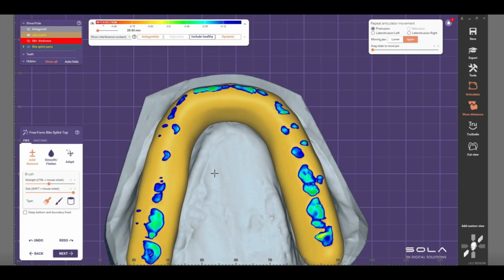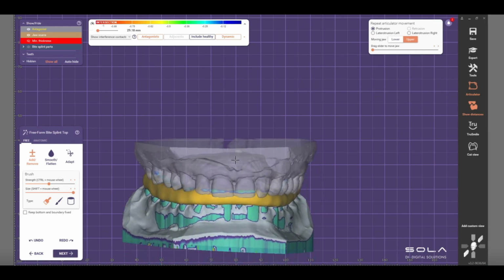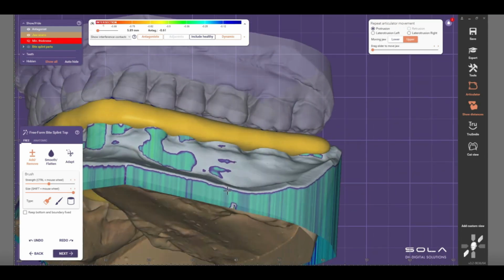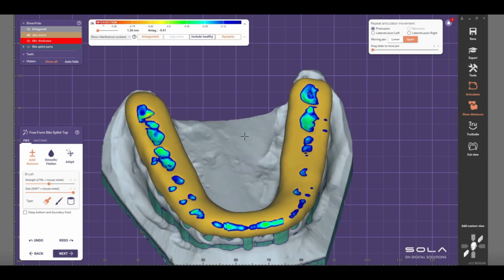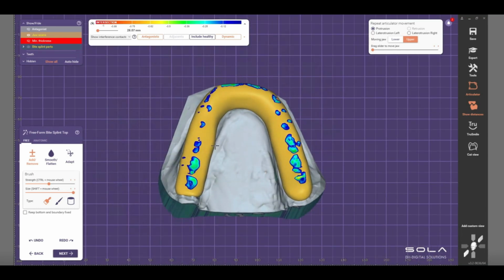And then I'm done. Looks nice. Let's bring up the opposing. I'll check one more time to take a look. All is clear. All is good. Make sure they are all okay. If I want to make any changes, I can. Slightly. If I'm happy, there, I'm happy, it looks good.